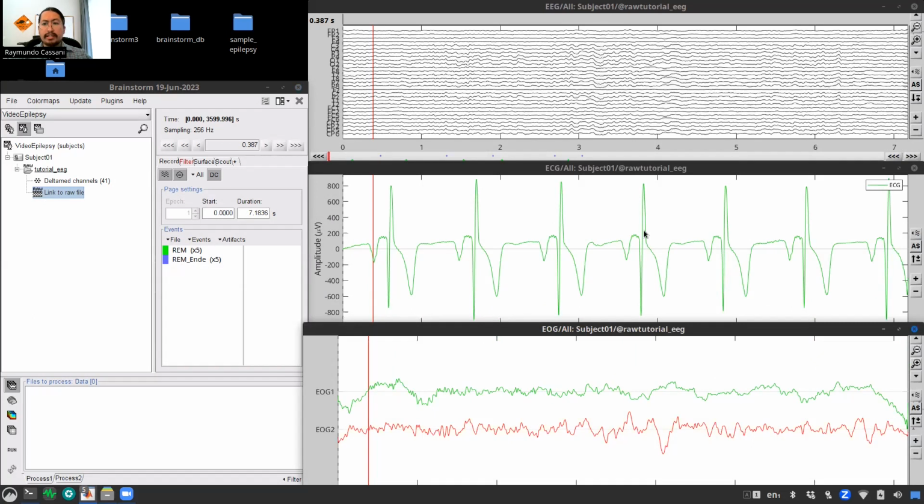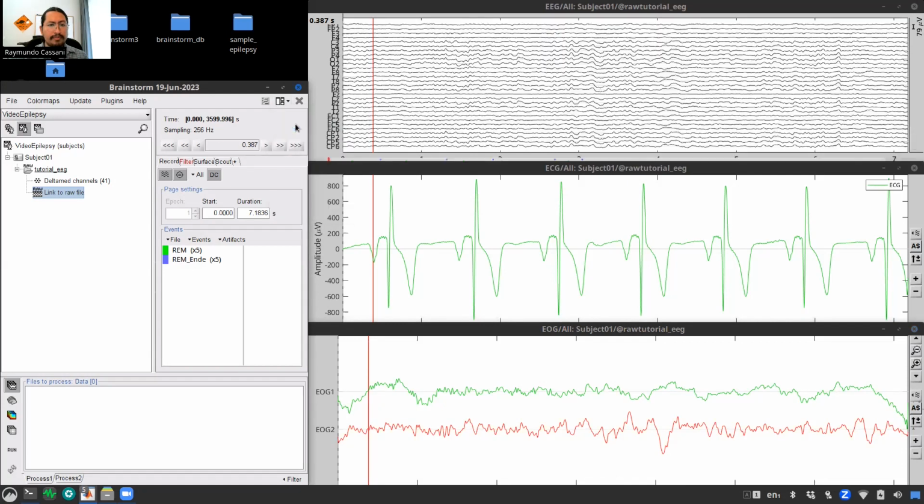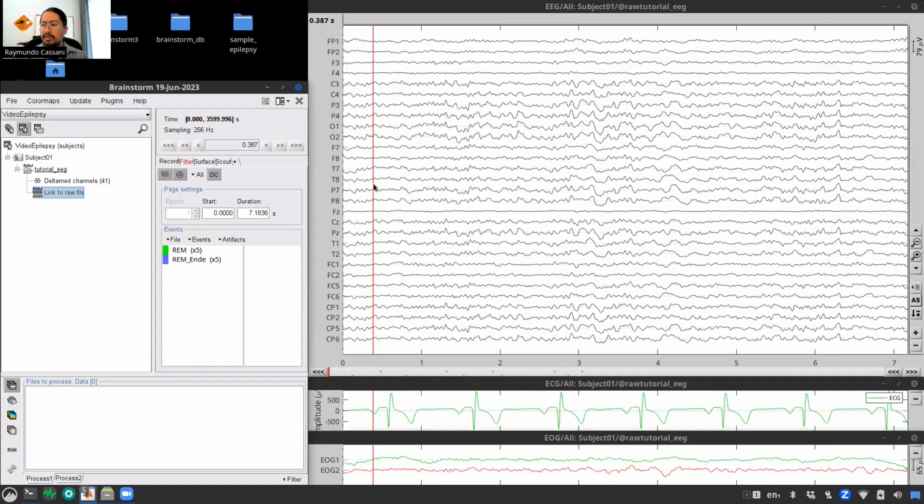All right. In this case, all the figures have the same size. However, we can change that. We can go again to the window layout option and select weighted. In this mode, it will assign more importance to the brain recordings, in this case EEG, on the figures.